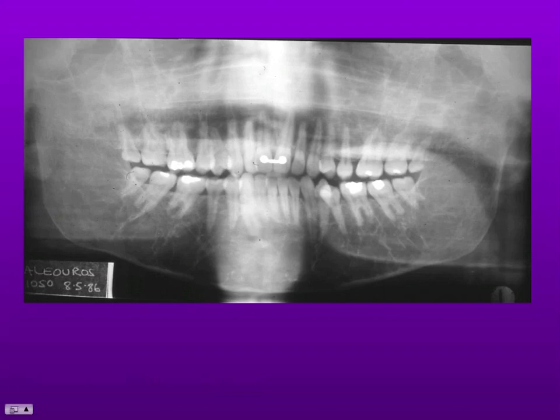I hope that you can see that this jaw abnormality is grossly abnormal. Whereas the maxillary antrum? Where is the maxillary antrum here? Where is the normal anatomical shape of the jaw? Where is the inferior dental canal? The normal thickness of cortex is gone, and we have this strange lacy pattern developing in the medullary cavities. Very odd appearance. This is another case of pattern recognition. If you see one of these, you probably recognize it when you see it the next time. This is a case of thalassemia.